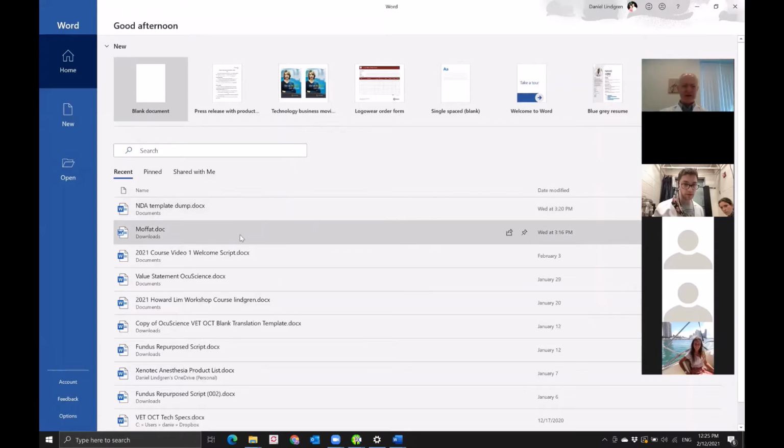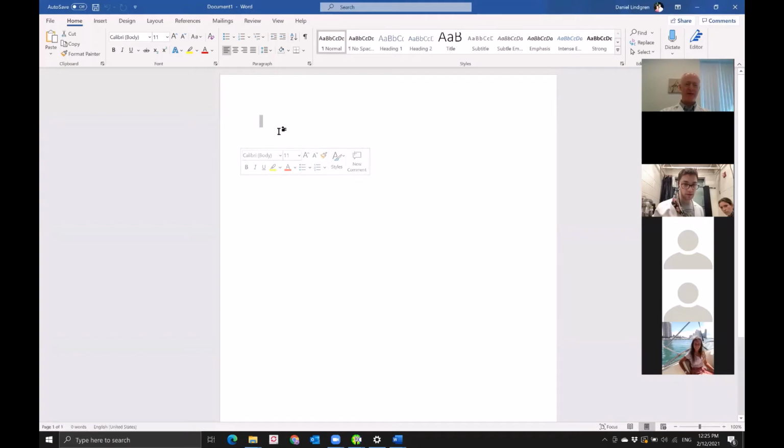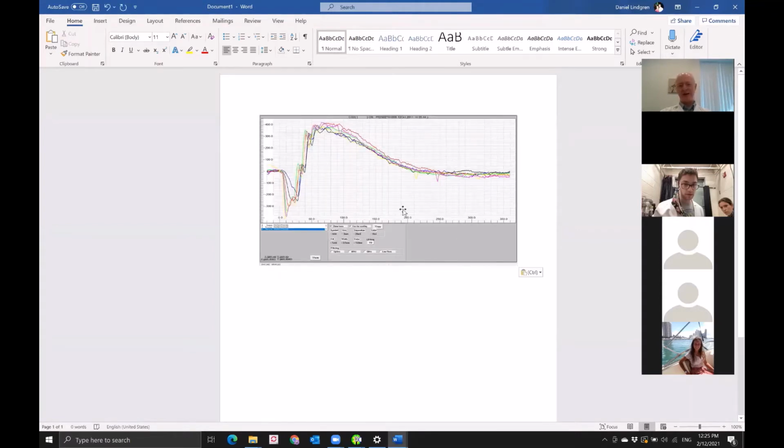I'm going to try to answer a question in just one moment. I'm going to show how I can copy the graph in here. And so as you get into your Word document, you can do the paste. And then clearly you now have the ability to take this image and use it just like any other graphic and put it into your documentation.